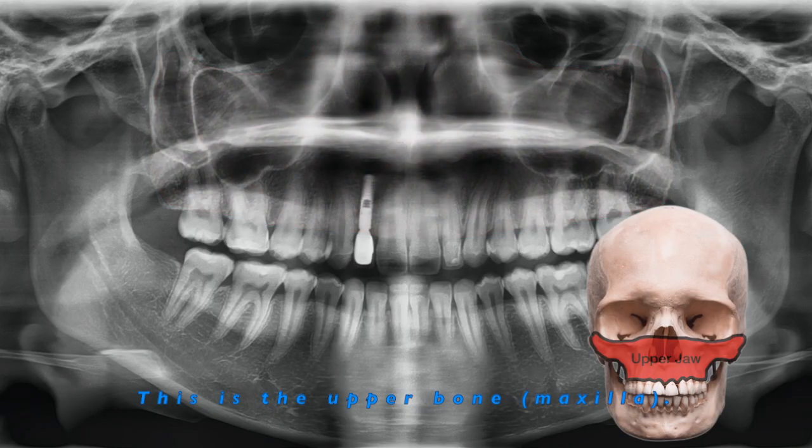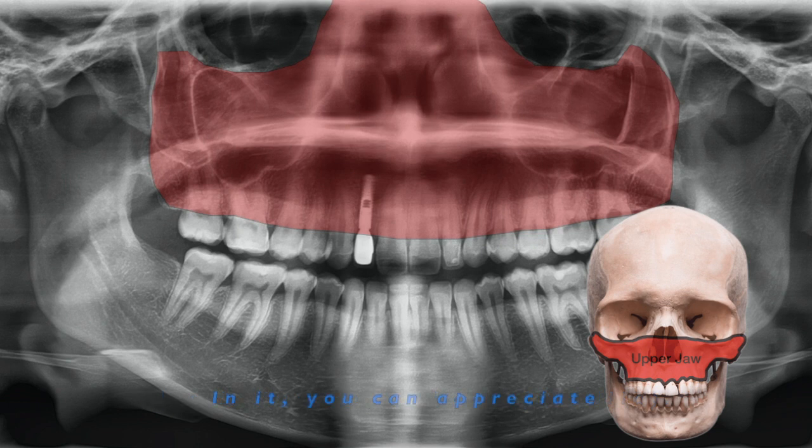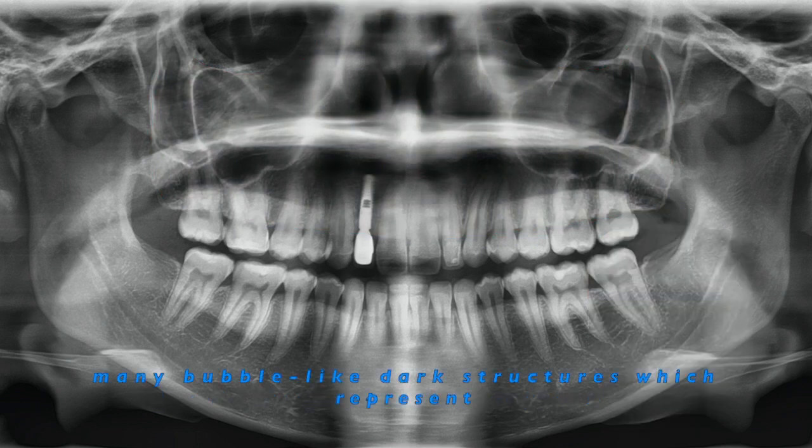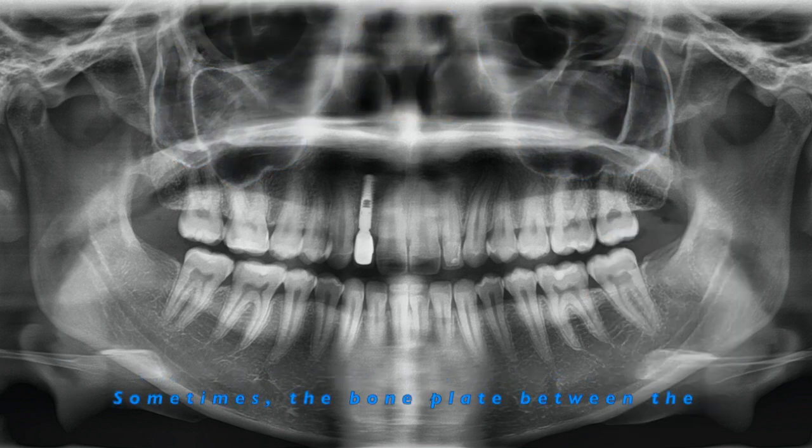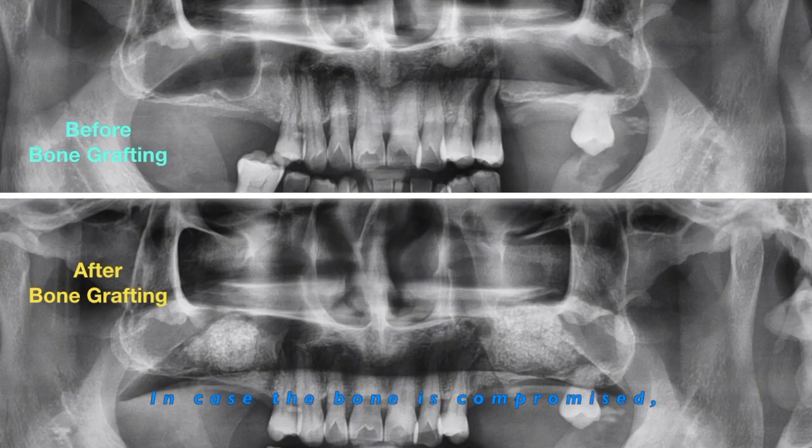This is the upper jawbone or the maxilla. In it, you can appreciate many bubble-like dark structures which represent the nasal cavity and the maxillary sinuses. Sometimes the bone plate between the floor of the sinus and the tip of the tooth roots may be very thin, so doctors have to be mindful during extractions and implant surgeries. In case the bone is compromised, a sinus lift and bone graft surgery may be needed, just like in this case.